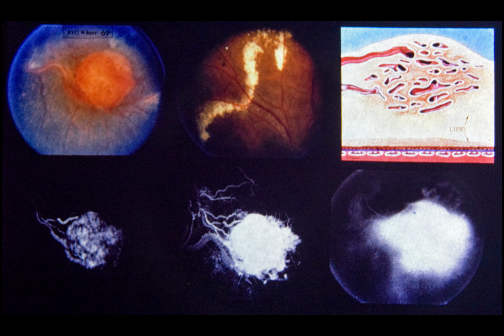Retinal edema was present throughout the posterior pole, and in some areas there was intraretinal and subretinal lipid deposition as seen upper center. Advanced cystoid maculopathy with lamellar hole formation was evident on fundus contact lens examination. Upper right, artist's sketch shows tumor, retinal edema, and lipid deposition in outer retina and in subsensory retinal space. In fluorescein photographs below, note typical filling pattern of tumor, lower left, and marked dye leakage into retina, lower center, and into vitreous, lower right.